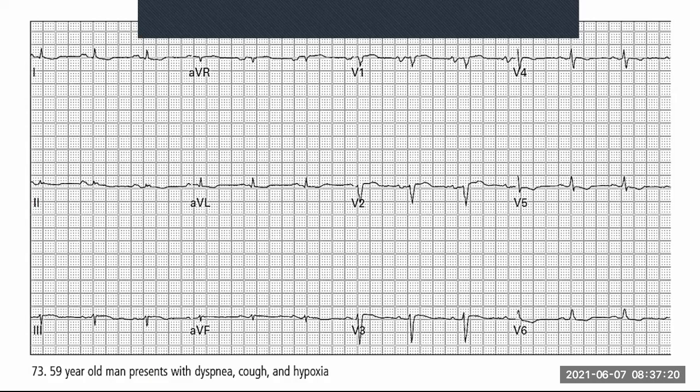Remember, ECG is measuring electricity, right? So it's one of two possibilities. Number one, your heart is not making enough electricity. Or number two, it's making enough electricity, but it's not reaching the leads, right? So if your heart's not making enough electricity, you're going to die, right? So the more likely answer is there's something blocking it from getting to the leads themselves. So what can block it?